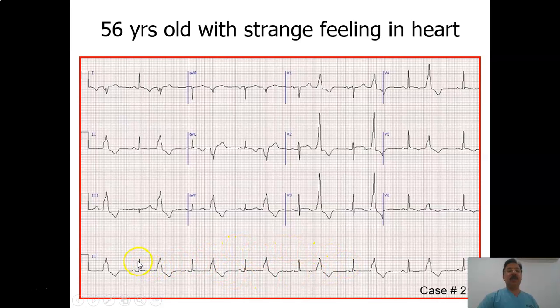The distance from this narrow R wave to the other narrow one is the same. The distance between the wide QRS complexes is also the same. So here we can apply the 6-second method, for example.